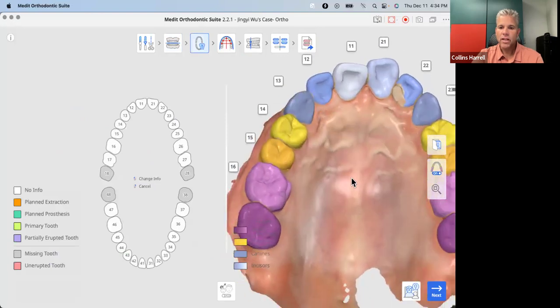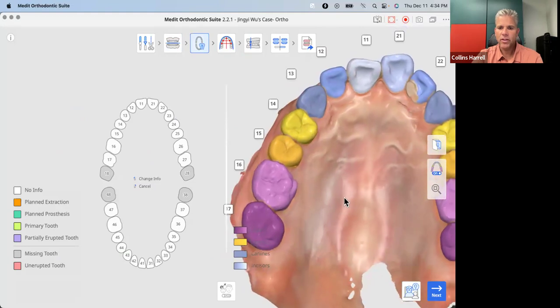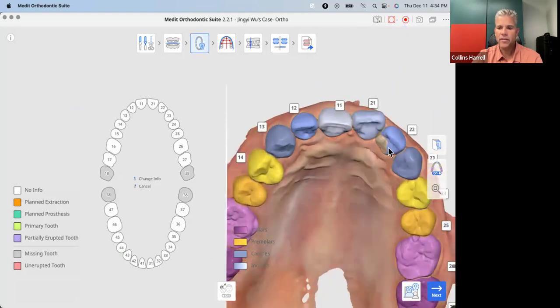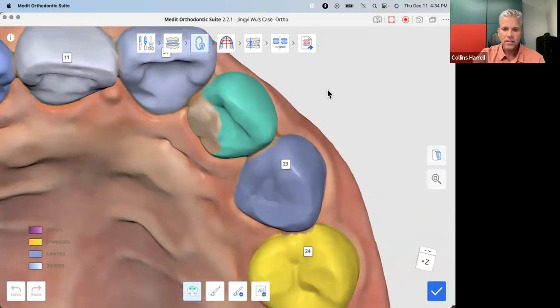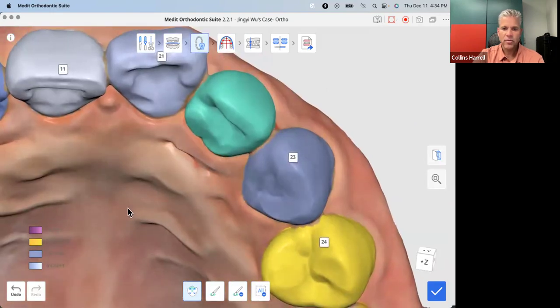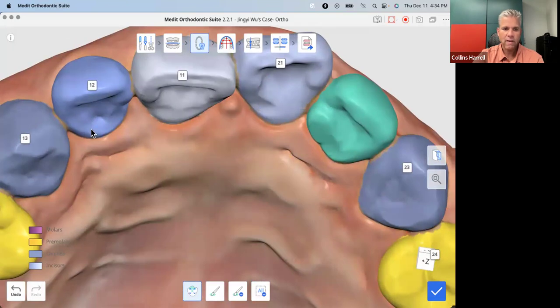I'm going to do some renumbering here. I'm going to call, nope, you're right. I don't know why that looked wrong to me, but you're right. This 2-2 though, let's pick up the rest of that. That's kind of an interesting tooth that has like a lingual cingulum or talon on it that's been worn down by the patient's bite. Strong muscles, you can see all this wear.